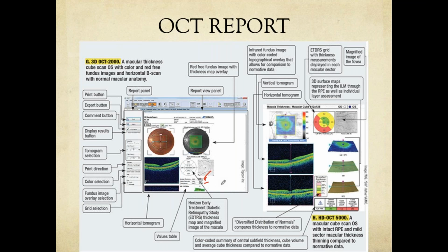If the overall average thickness of the retina is thin, in cases such as eyes with higher myopia or due to hereditary or genetic cause, what you need to do is now scan the contralateral eye. If both eyes give you a similar impression, then for that person, the volume 6.6, although it seems small, is the normal value for that eye. That's how you determine it.